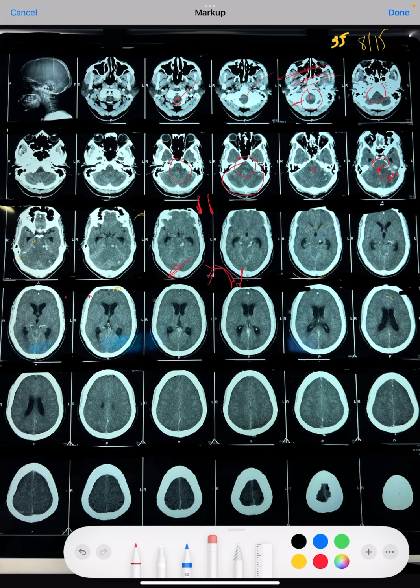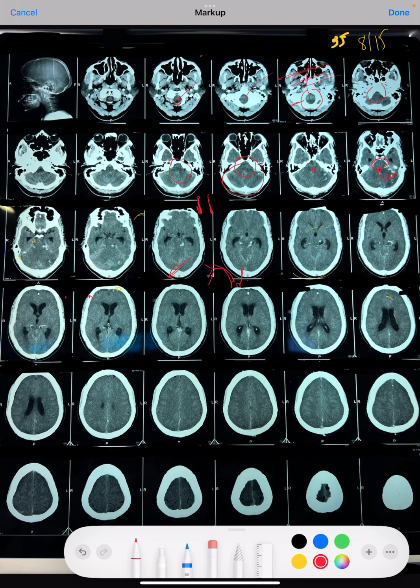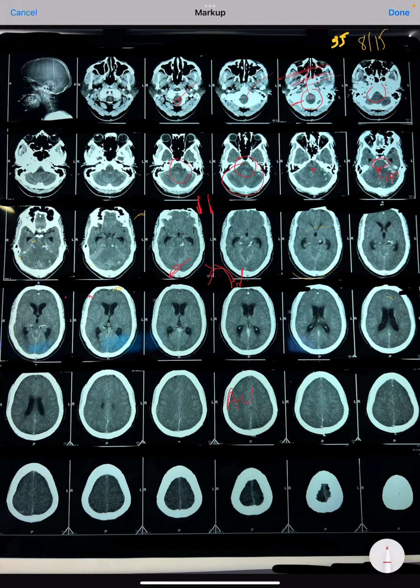So this can be either an aneurysm of a particular artery of the posterior circulation, or the second thing, it can be an arteriovenous fistula. The artery will be around the external carotid or internal carotid, and the venous side can be any venous sinus.